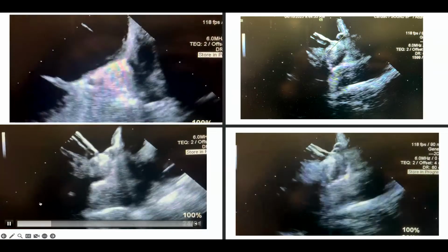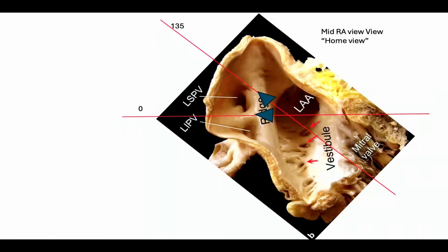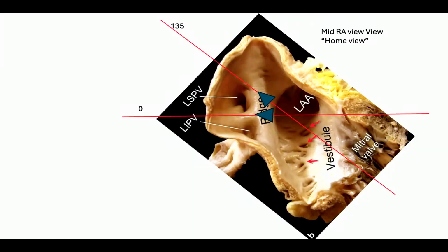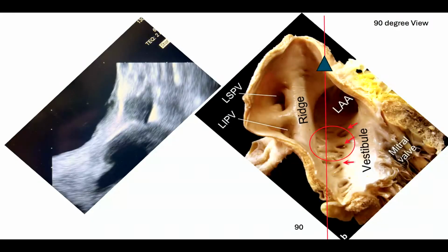However, all these views are really good, and actually the one that looks the best usually is the very first one that I showed you inside the pulmonary vein. All Watchmen look fantastic over there, but that's not the storyteller. The storyteller is this guy, the one who shows you the floor of the Watchman, which is this view right here.